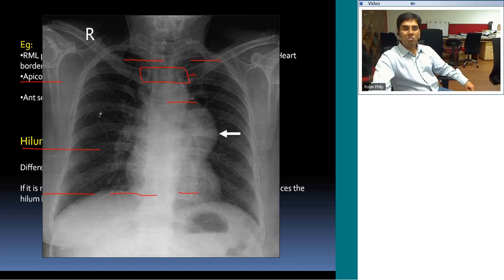Right, you can see this. There is a mass in the left hilum, right, and you can see the hilar structures through it. That means this mass is located either anterior or posterior to the hilum. So this is called a hilum overlay sign. Whereas if there is a large pericardial effusion, this will actually push the hilum laterally like that. So that is hilum overlay sign.